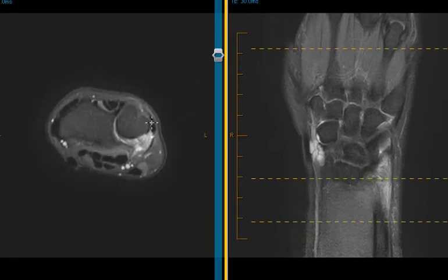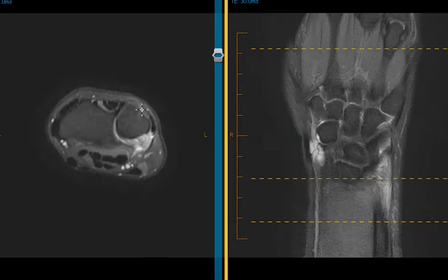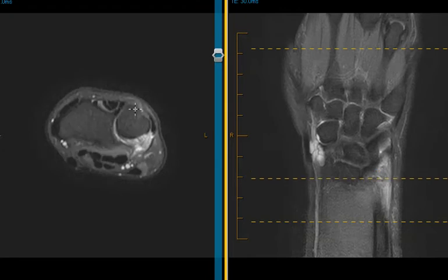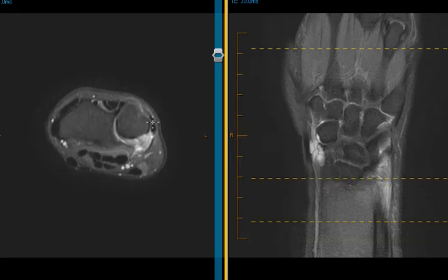The other thing we notice is this is the extensor carpi ulnaris tendon, the ECU. Normally it will sit in a little groove here, and it'll cross over the distal ulna in the little pivot or divot here, and this one is slipped backwards. It's hanging over here behind the ulnar styloid. This is subluxed posteriorly, and so they may have an injury of the extensor carpi ulnaris tendon sheath. It's part of the TFCC complex, and it helps hold this in place. So they've had a probable injury out here with a tear of that palmar radioulnar ligament.